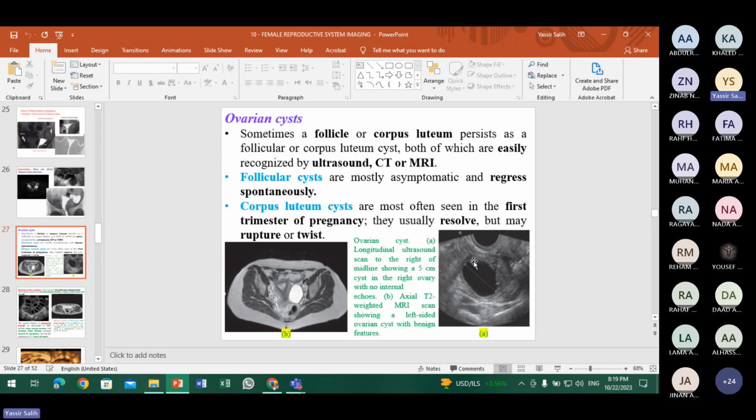What is this examination? Ultrasound. Transvaginal? Yes, transvaginal, or transabdominal. Transabdominal. So why transabdominal ultrasound? Is there a filled bladder above it? Where is the bladder? Or is that part of the image above the cyst? Or is that just normal? No, this always looks normal like this, okay.